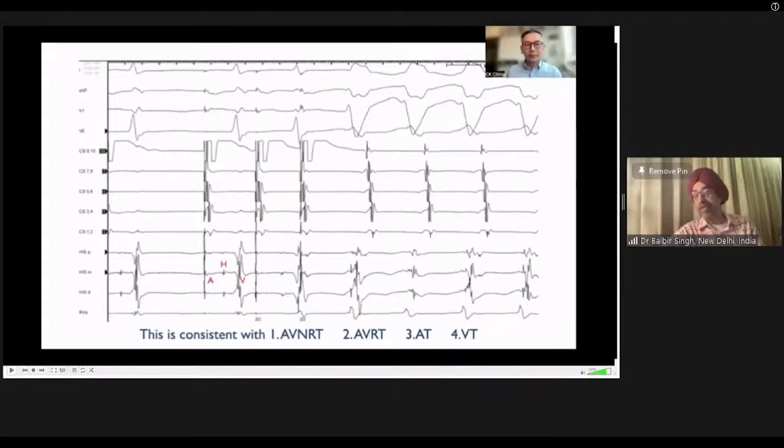Now, this is a tachycardia which is a left bundle branch block morphology tachycardia, which is regular. But if you look at the H, it is just merged here, and there is activation which is distal to proximal. And this has been triggered by the atrial pacing beat. The next thing that you want to understand is the initial R of V1 on the ECG. It is a very rapid initial R. So this tells you that this has to involve the bundle of His Purkinje system to produce this sharp deflection.